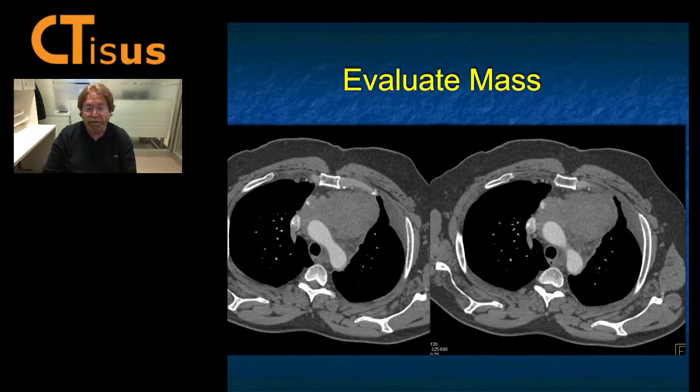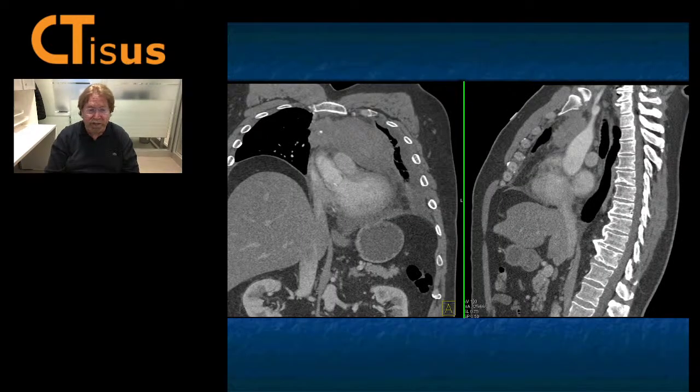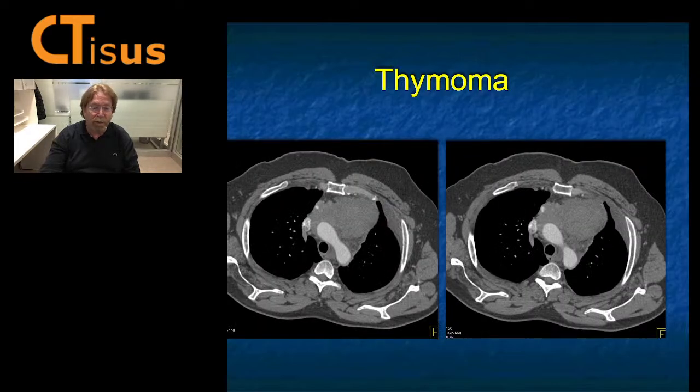Another case, anterior mediastinal mass, lymphoma, usually multiple nodes, but could be a big mass. Teratoma, usually calcifications and fat. Thymoma, often eccentric, like this case is. It's not thyroid growing down, there's no vascularity, and I'll tell you the neck was normal. Metastatic disease is always a possibility. You can see it a little bit better here on the coronal and sagittal. And to no surprise to you, this was a thymoma.